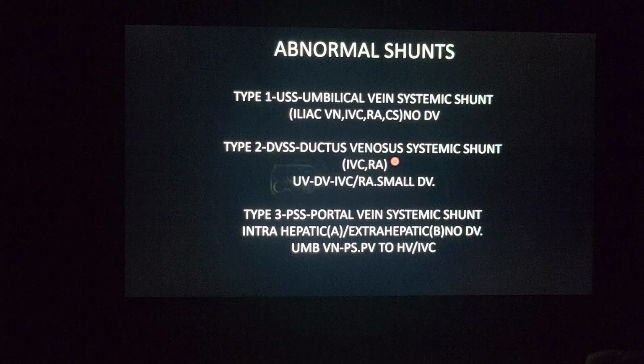Type 2 is DVSS, ductus venosus systemic shunt. So here there is a ductus venosus which is small or abnormal, and that shunts into IVC or right atrium.